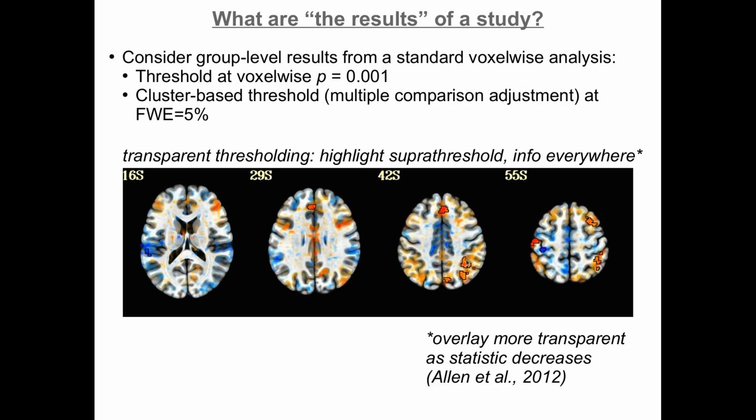And there are interesting things, like this region that has high yellow, hot color values, high positive significance. Actually, you do see something partnered with it on the left side of the brain, but at lower significance. Or this region actually represents something across this whole sulcal gyral pattern, and there is something left-right homologous here. Or this region has a left-right partner that you wouldn't have seen at all. Maybe if you added more subjects, these would become more significant, or maybe some of them would go away. But something like this and like this look like they might be of interest.